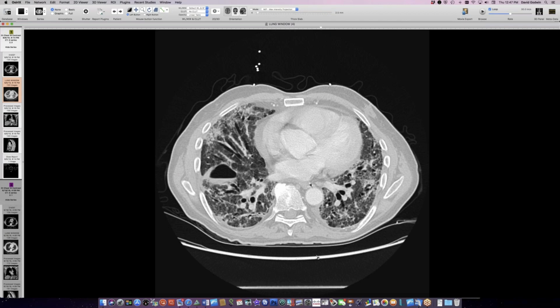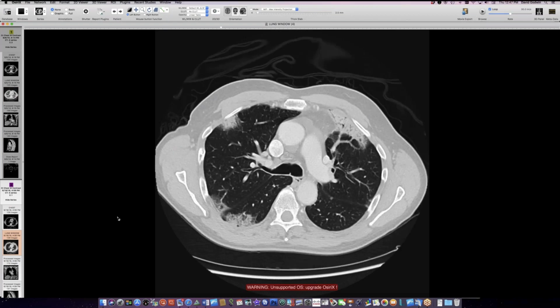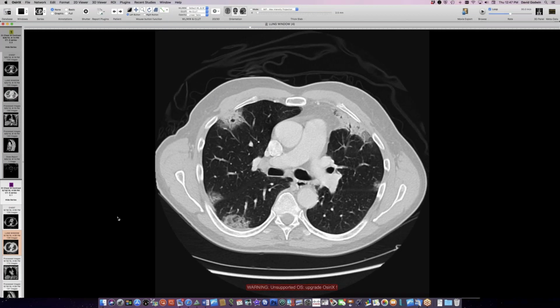So I'll try to get the whole immune panel that's been done on this patient. Rapidly progressive lung disease, the most dramatic case I've ever seen of an organizing pneumonia pattern as the initial CT manifestation. Is that just a few months? This is in the course of 2 months. Was the patient on an immune modulating drug? You may have mentioned it, but at the time, one of these new -mab, -ib drugs, that this could all be drug related and not the disease itself, or was the patient not on anything for their rheumatoid arthritis?